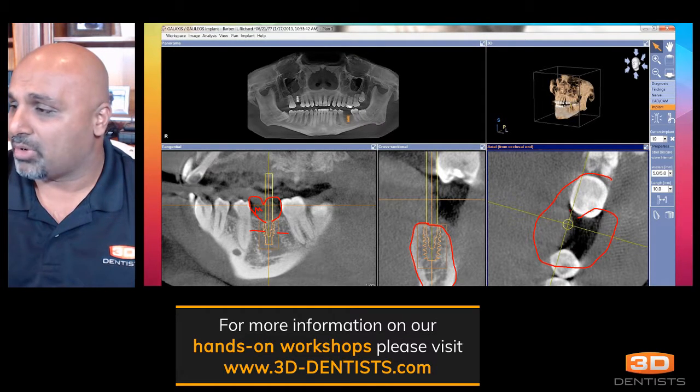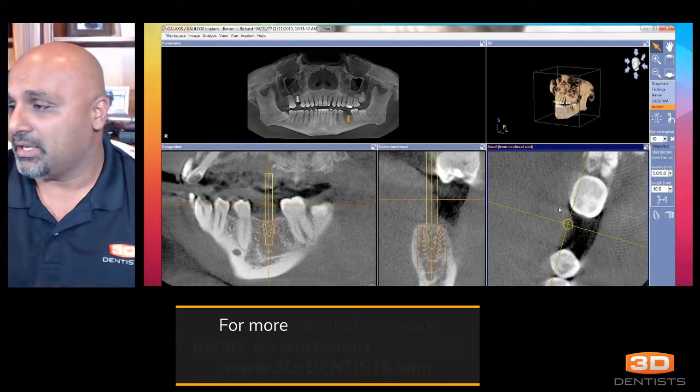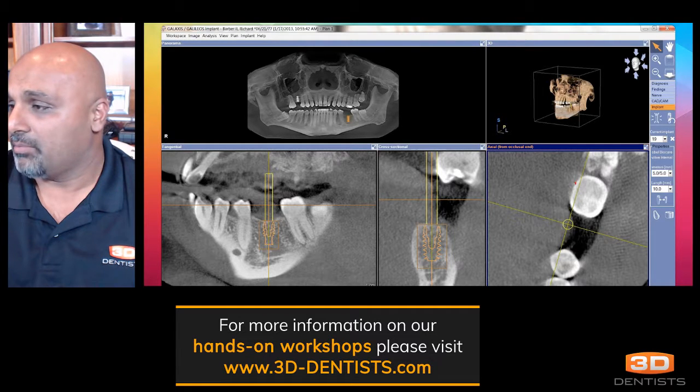And this is important because of the way I mentally visualize this. When I'm doing my planning with or without CEREC data, I will draw a line on my lingual.